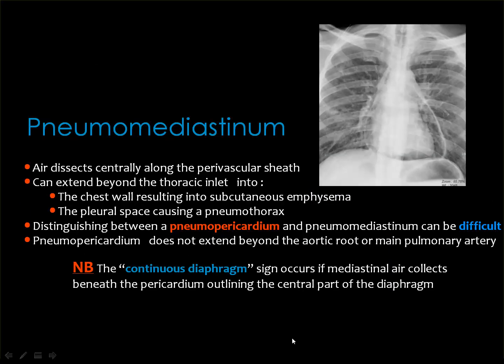And these are sometimes, they said in the literature, it may be difficult to differentiate between pneumopericardium and the pneumomediastinum using the chest X-ray. But I think that one of the helpful signs for pneumomediastinum is the presence of air at the root of the neck.